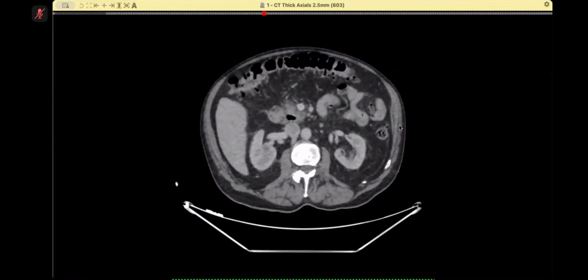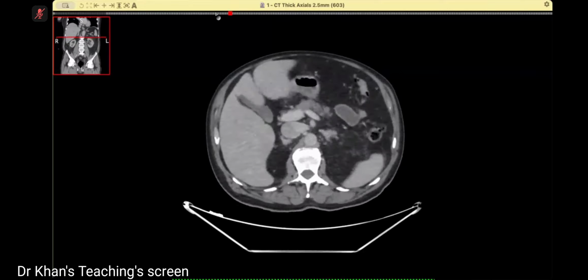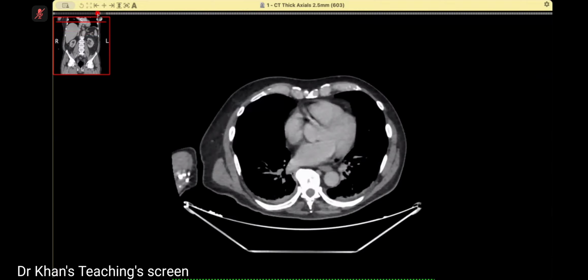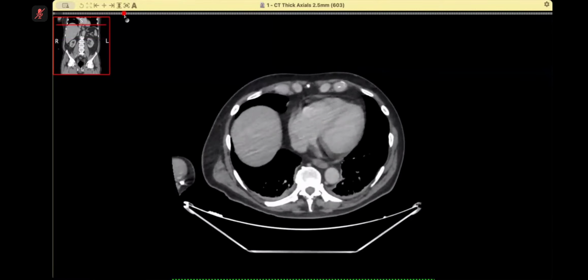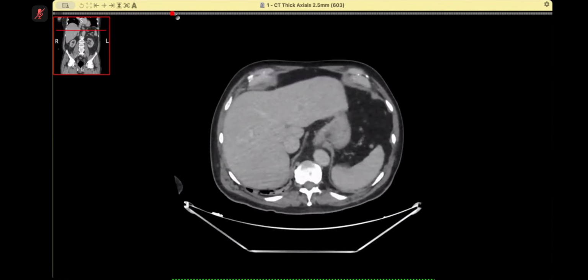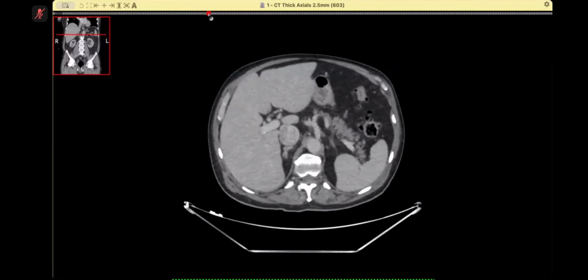Okay, so I'm asking for the... Okay, sir. So I'm provided with the CT scan axial section. I'll go to the top and then scroll through the whole case. So the first abnormality I can see is that mild bilateral pleural effusions are seen, and it's a portovenous phase. Liver is unremarkable, as are the spleen and pancreas and bilateral kidneys.